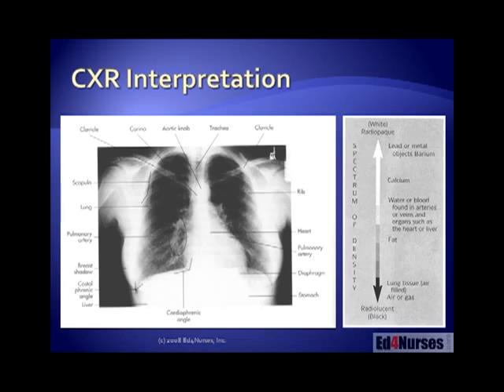Also be looking at the abdomen, and you may see some things happening in the abdomen as well. These could be clues that you've got something going on here. Okay, now let's get into the actual interpretation using a 5-step method and look at some X-rays, and hopefully you pick up some pointers that you can use the next time you encounter a chest X-ray on your patient.